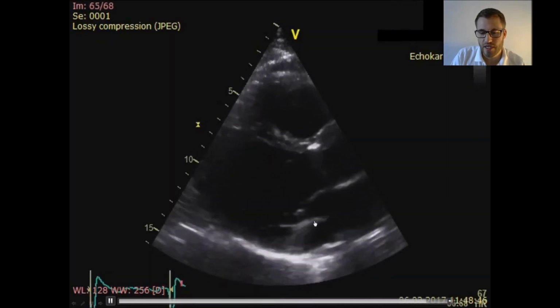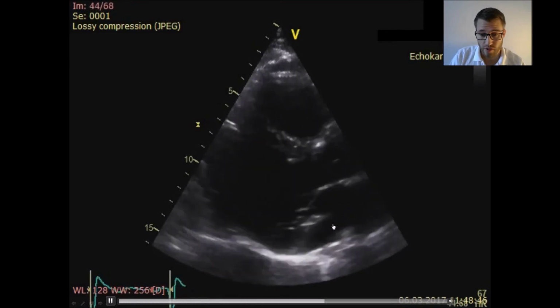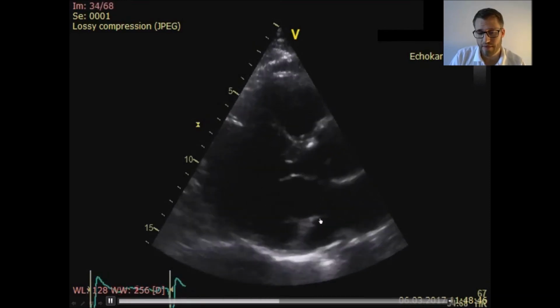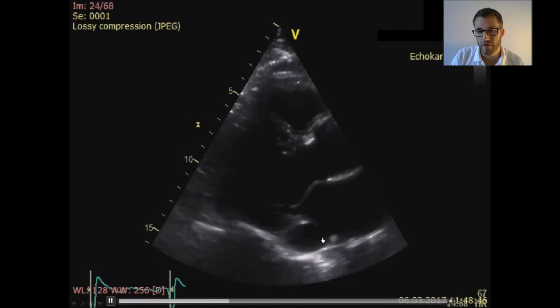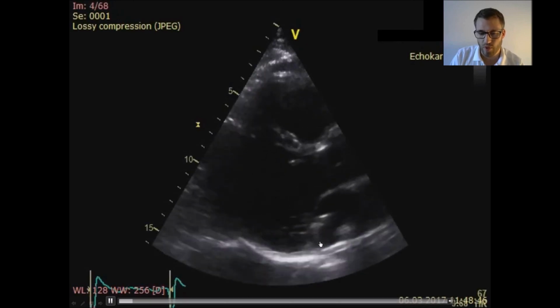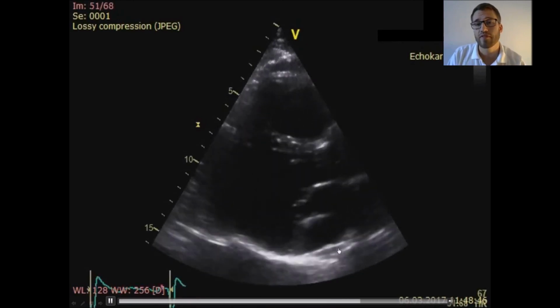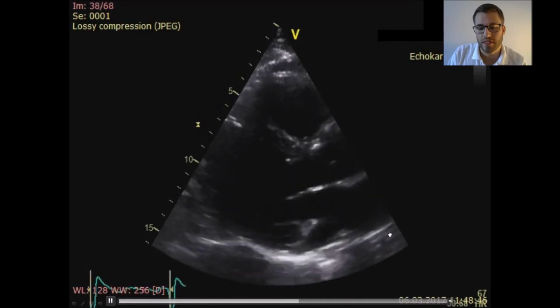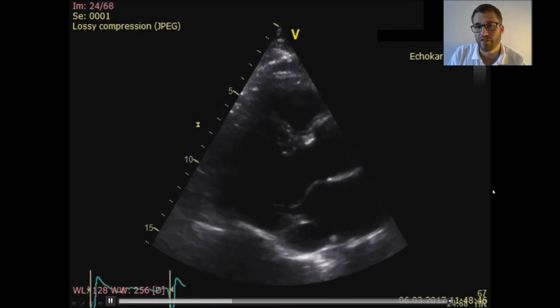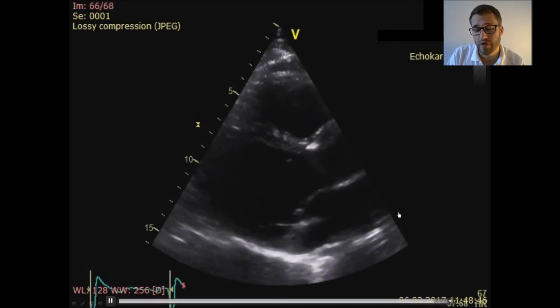So if you see this structure, it can be a mitral sclerosis, of course, but it can also be the coronary sinus. And you will see this very often, but not as prominent as in this case. And if you have such a prominent coronary venous sinus, just think about the diagnosis of an anomaly and the persistent left vena cava superior.